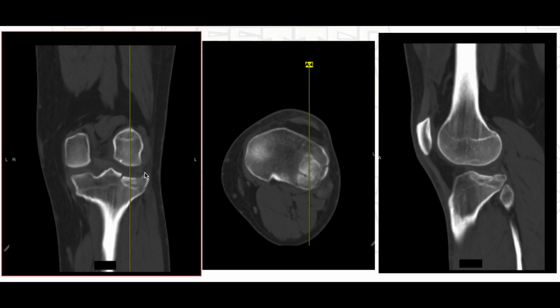So in this case, the patient has a lateral tibial plateau fracture of their left leg, which you can see here in the scan. One of the first things that really pops out to you is the fact that the space between the distal femur and the proximal tibia has widened significantly, and that is happening because there is a depression of this lateral tibial plateau here.